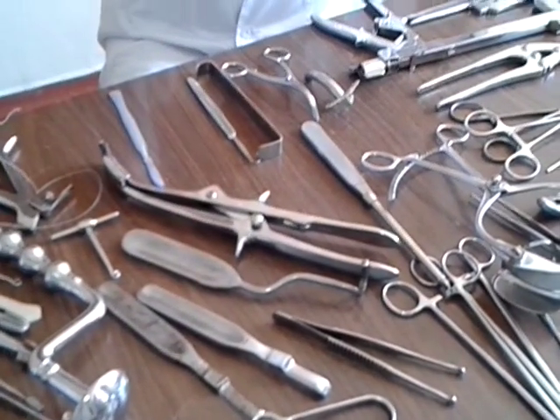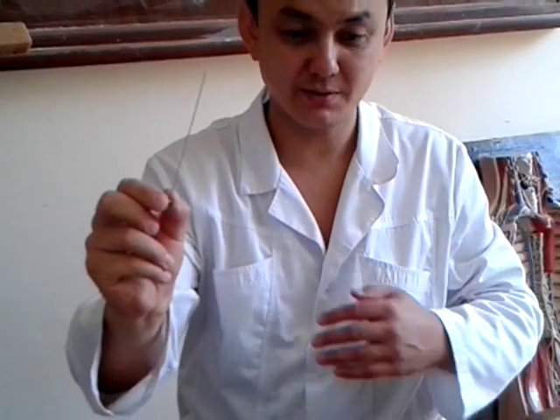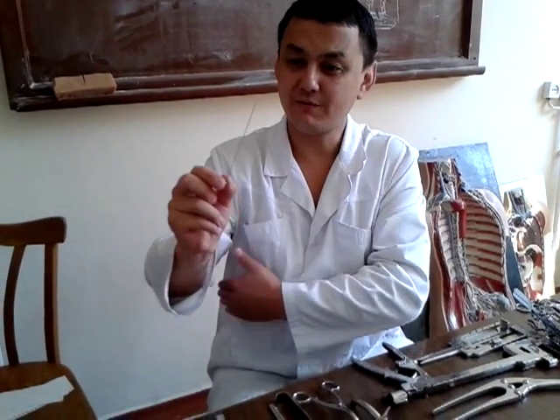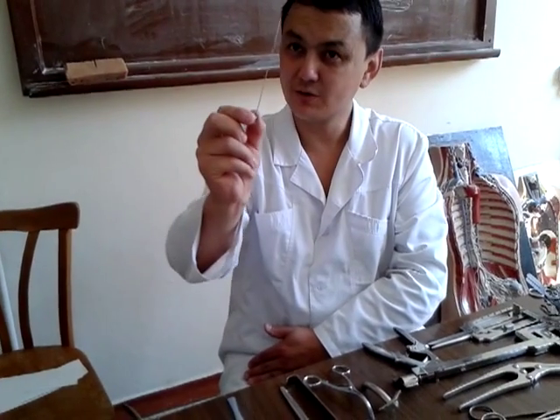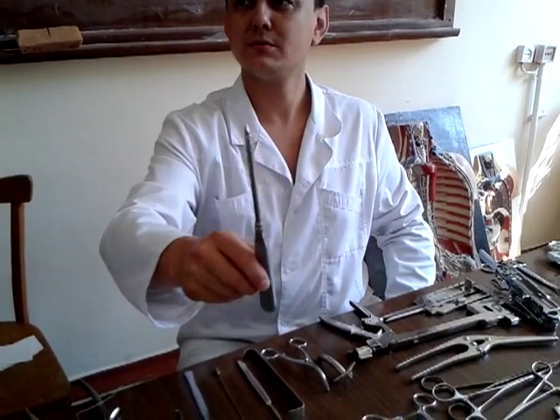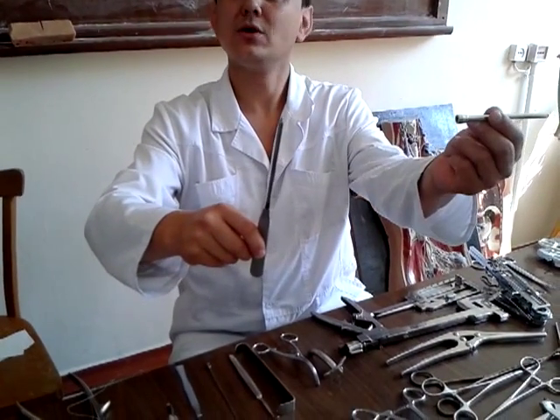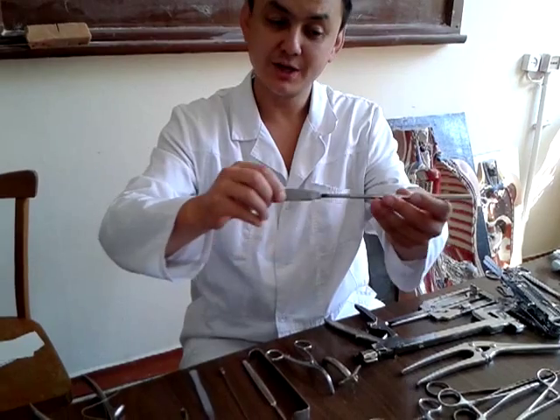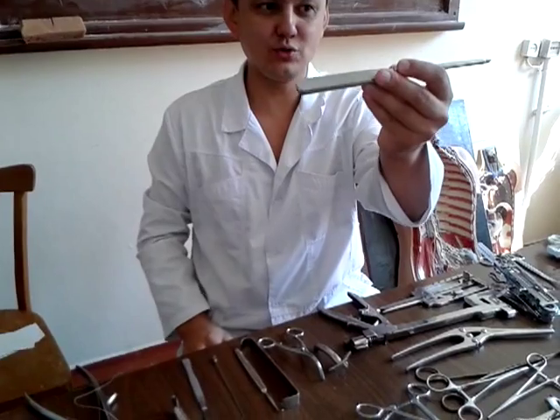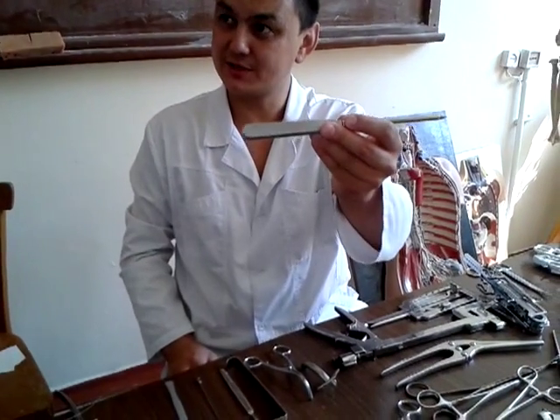What is it? The puncture needle, to puncture, for example, the pleural cavity. For pneumothorax, the superior part; for hydrothorax, the inferior part of the thoracic cage. It is also used for vagosympathetic blockage, and for lumbar puncture. The correct name is thoracocentesis. If you use the trocar, the name of the instrument is trocar.